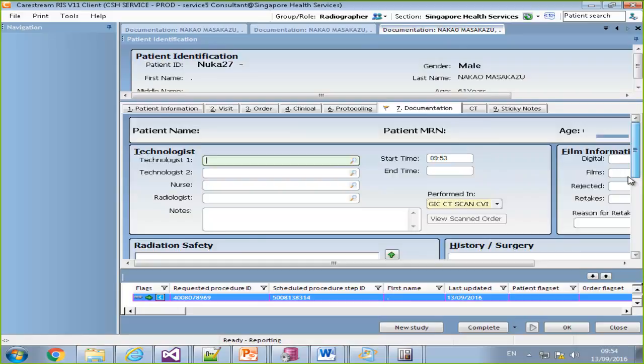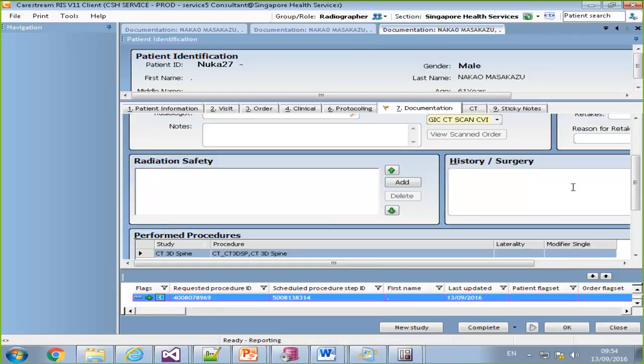Just one sentence about the screen you just showed. Since we're creating 3 studies, taking them to arrive status, and then opening 2 forms, it's a little bit heavy for RIS to do all the things, because it really also goes to the server and creates studies, and also makes the GUI create 2 forms, which in data windows is a pretty massive action. So we worked a lot on the performance of this whole issue.